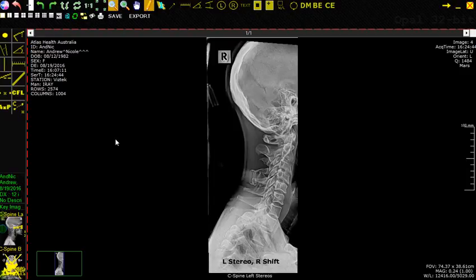So we're looking at a couple of oblique lateral x-rays, but at different angles. Now, most of the tools for doing this are already in the software. So this might be more demonstrative, but maybe also adding an additional line and feature.